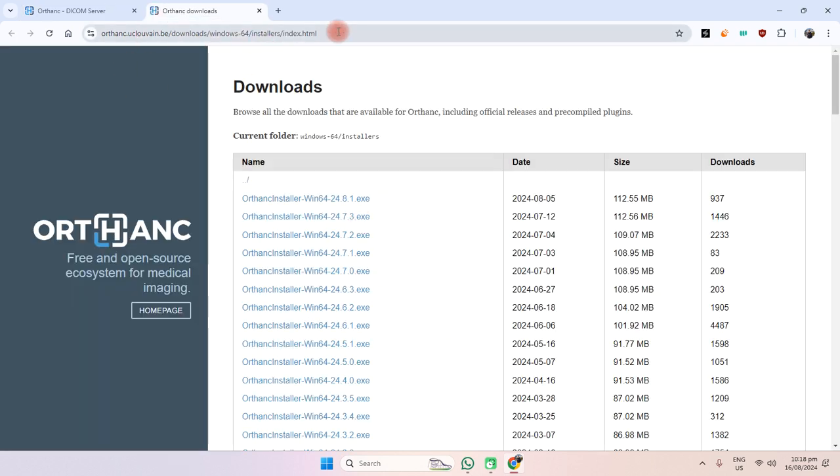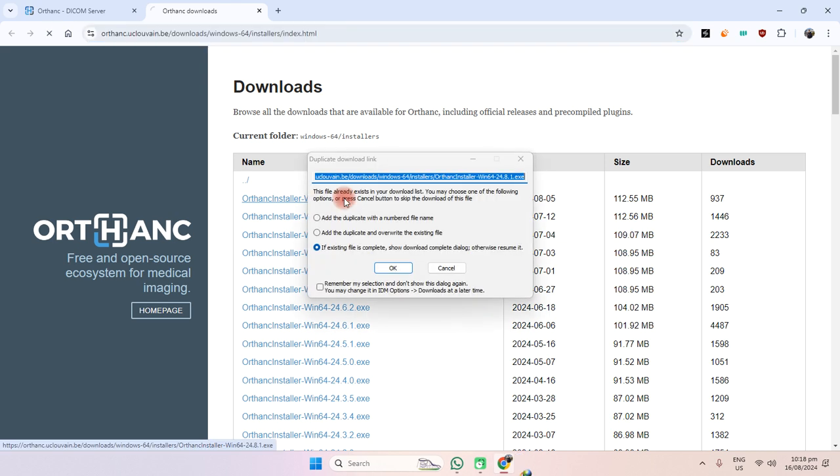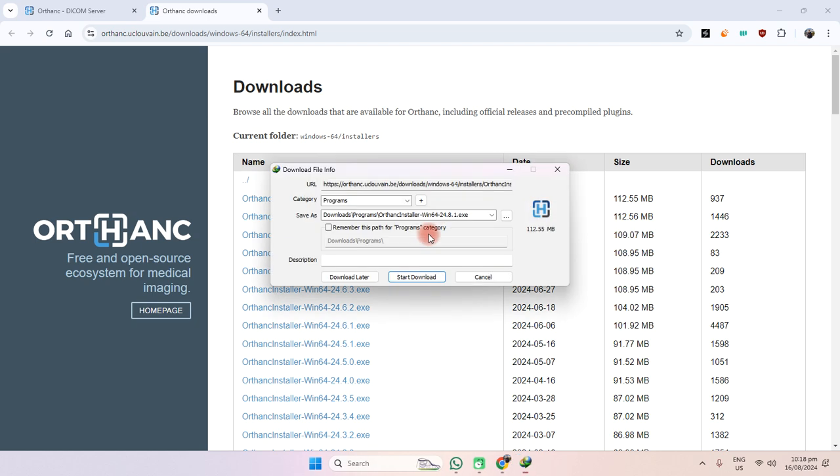I will also add these download links directly in the video's description. You can download whatever version you want. So I am downloading the most recent. In fact, I have already downloaded it. It's in my download section.